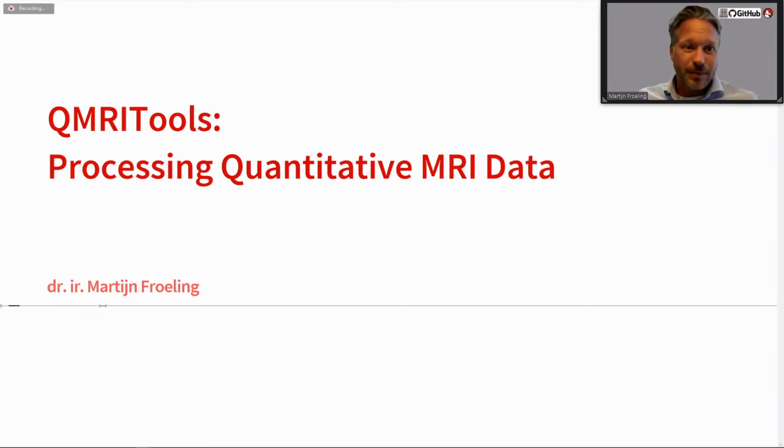Hi, everybody. My name is Martijn Froeling, and today I will be giving a talk about my toolkit, QMRITools, which is intended to process and quantify quantitative MRI data.